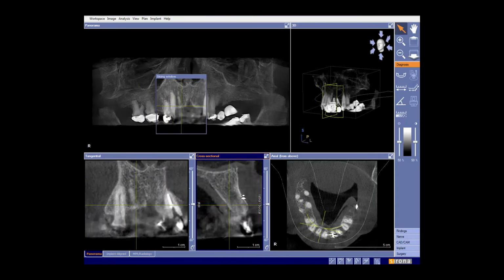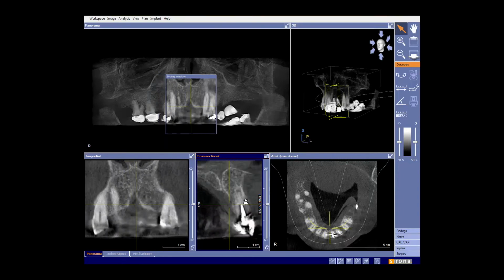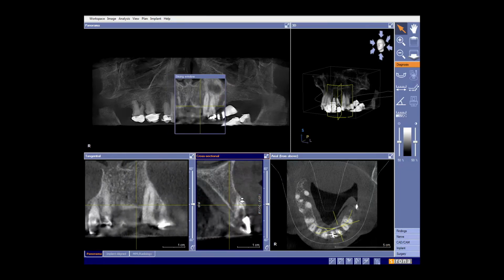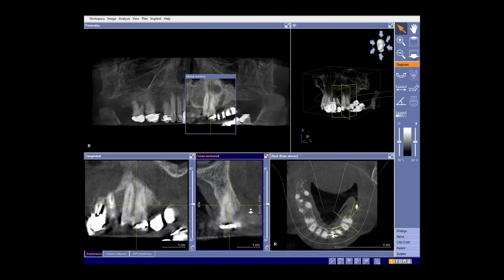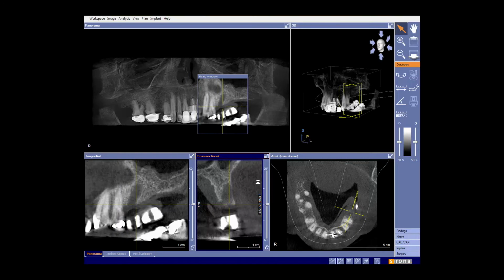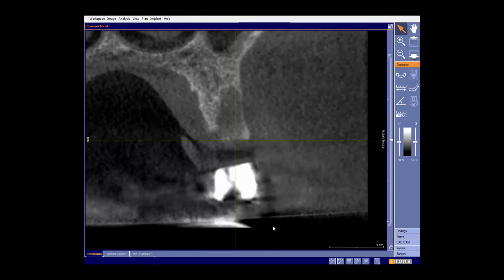The top right of the screen is a 3-dimensional screen. You'll see abnormalities in the upper anterior region become visible on the cross-sectional views, including apical areas and the incisors. As we tab towards the right side, you'll begin to see a socket emerging in this area, which is planned for possible implant placement with a false prosthetic tooth beneath to orientate an implant.